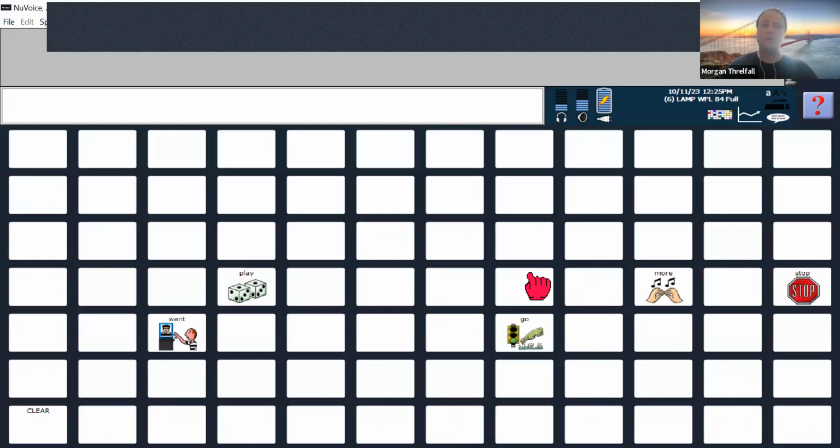So it's very quick to hide and show words in LAMP Words for Life. Vocabulary Builder is unique to LAMP and Unity and a really fantastic tool. It can help the student, can help the parent, can help the teacher to be able to use it more effectively.